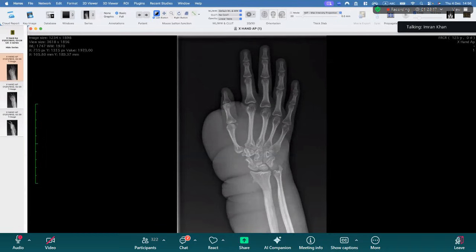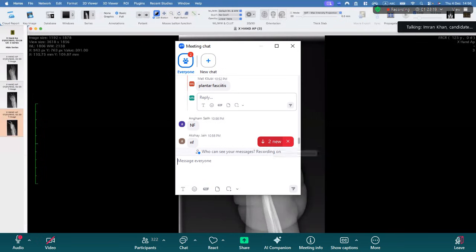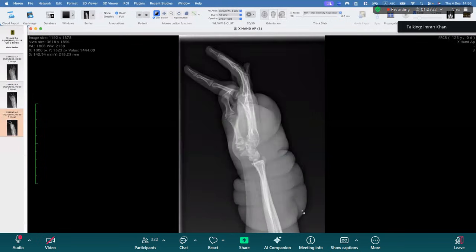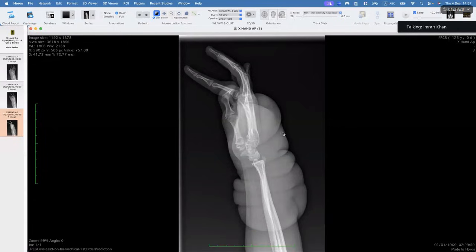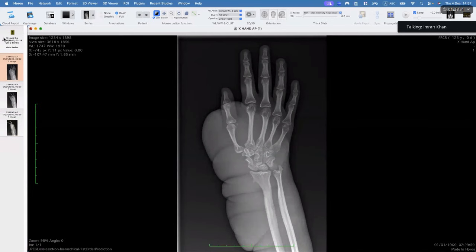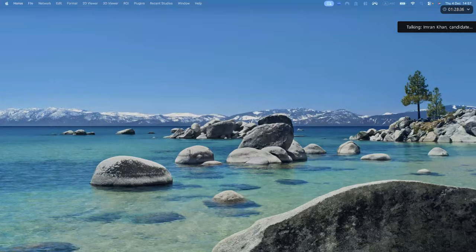This is neurofibromatosis. And this is a large, big, giant plexiform neurofibroma in this patient. Look at the soft tissue here. Look at the soft tissue there. There's nothing going on there, but this is completely abnormal. All right. The second case is actually also kind of like an Aunt Minnie.